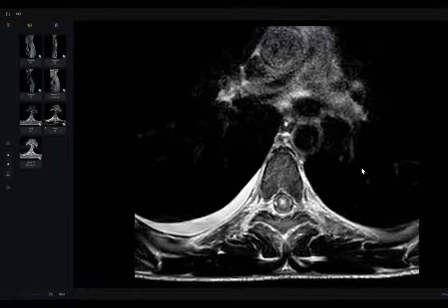In the first case of today, I said when you find a leptomeningeal enhancement of the spine, think about metastasis versus tuberculosis. So try to have a look at the lung. Here was the tricky point. By the way, this is a typical case scenario of long cases exam. I give you a very, very long case full of details and just one clue, in one slice.